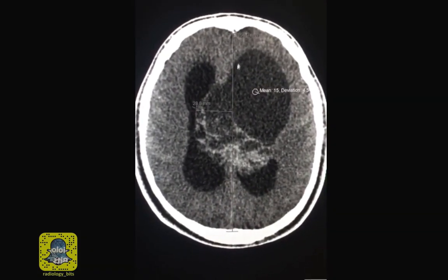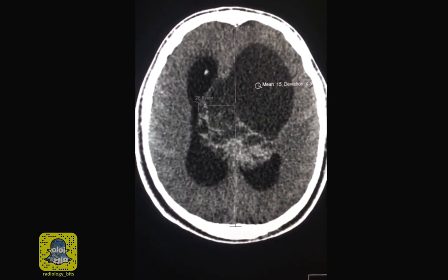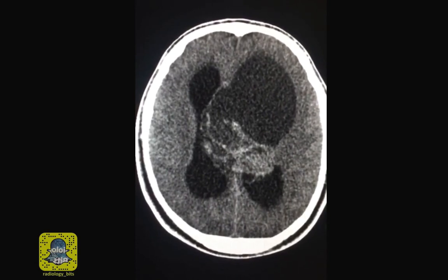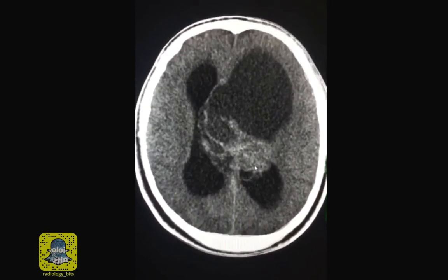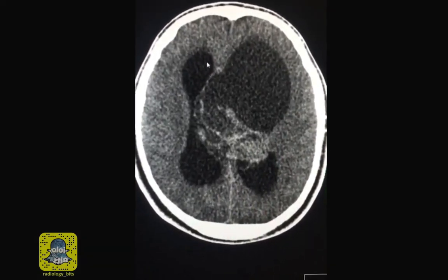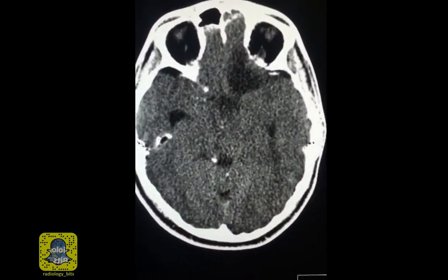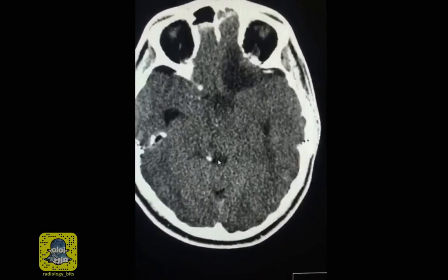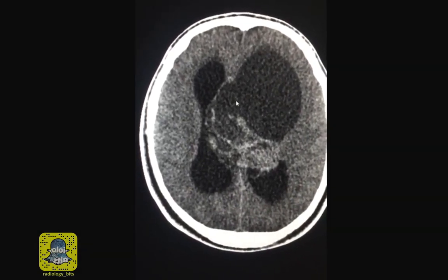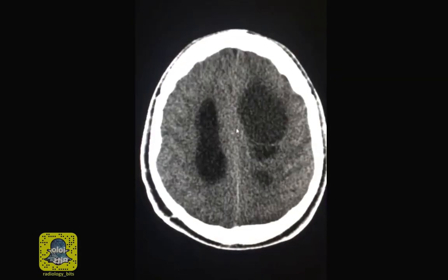The lesion has a cystic component that has a low-density fluid which is different than CSF, and a heterogeneous and somewhat bubbly appearing soft tissue component which shows high and low density. There is associated hydrocephalus, which is sparing the ventricular system in the posterior fossa, such as the fourth ventricle. So a large cystic and solid heterogeneous lesion that leads to obstructive hydrocephalus.